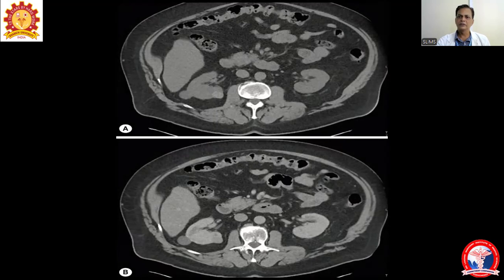Here we are seeing all simple basic things. Again, the choice of images is done as per the frequency, the things we frequently get to see that are clinically important. We are having discussion on that. So first we saw pediatric calculus, which is quite often an emergency, and patients come quite frequently. Second, we saw medullary nephrocalcinosis.